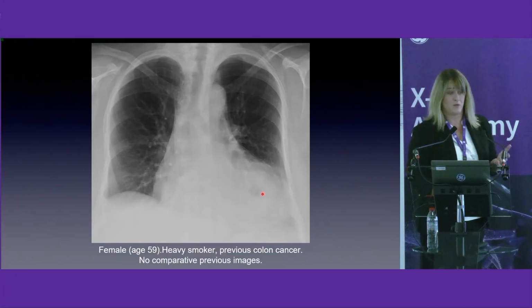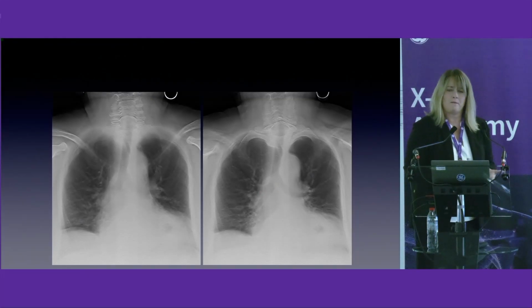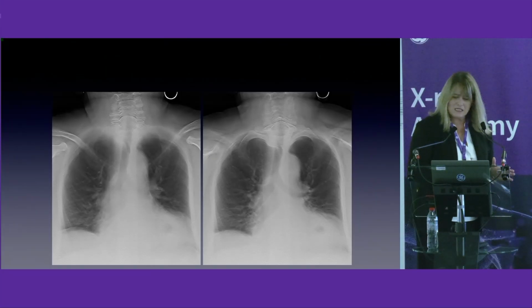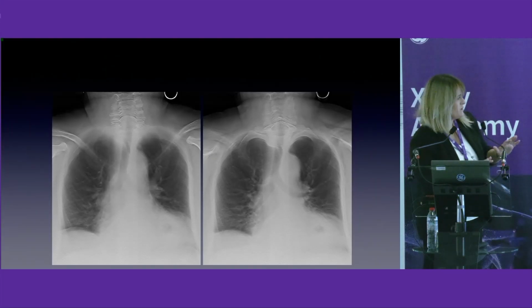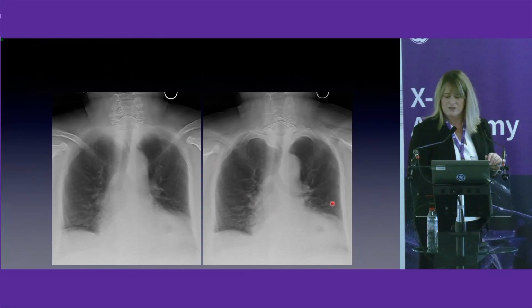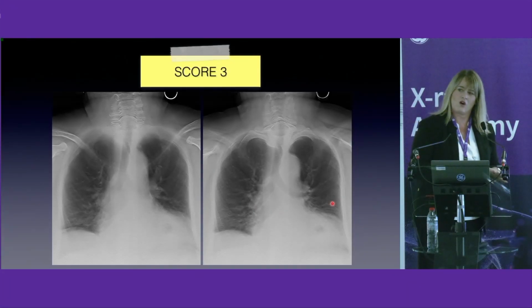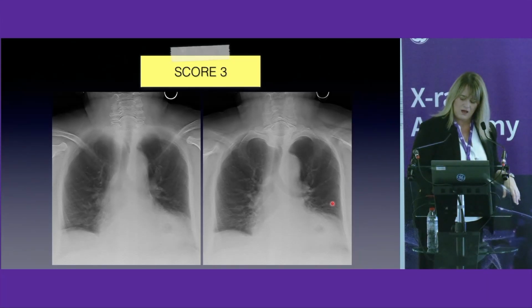So we decided to perform a DTS. However, this patient wasn't able to keep an adequate inspiratory apnea. So, as you can see, it's quite blurred. We are not able to distinguish the edges of our structures. So, we weren't confident regarding these findings.